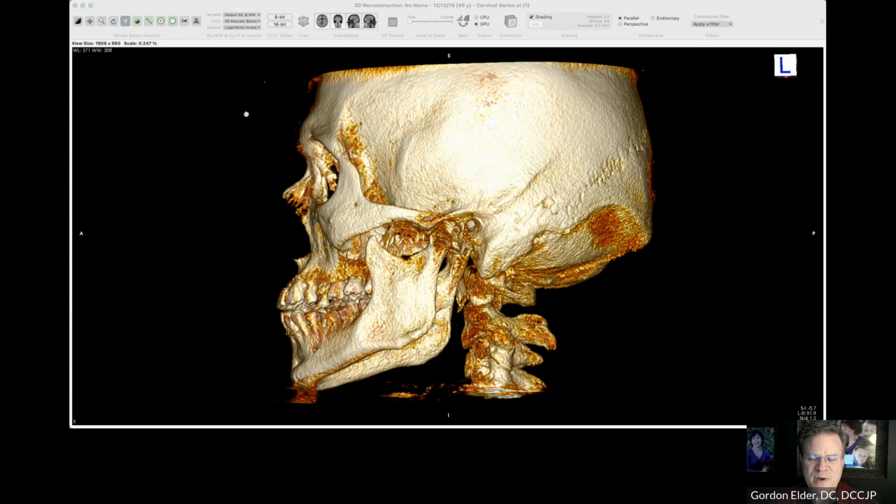The one that most of my friends use is Carestream 3D. Carestream 3D is also a free program. It is made by one of the companies that makes cone beam machines, but you can get it at no charge. It's a very good program, has very good 3D effects. We don't analyze based on the 3D. We look at the MPR or the sliced version, but it's very nice to be able to overview things, which is what we're going to do here first in a minute. That's the one that most people use for PC. There's other programs out there. You have to learn how to do these things with your own program.